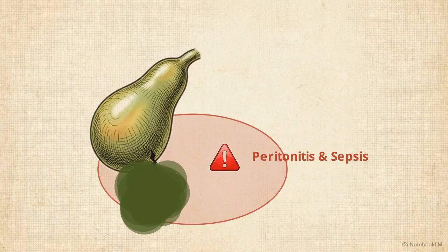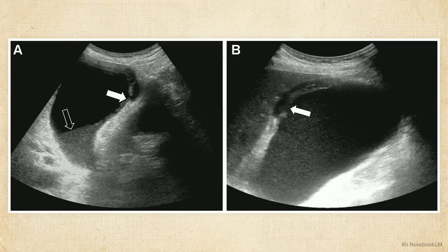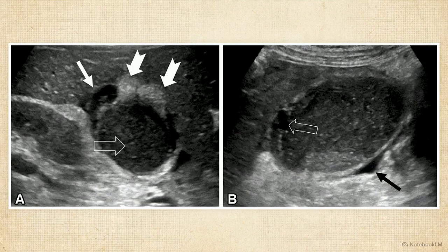This ultrasound clearly captures a blowout. You can see the distinct focal defect in the wall, with complex intraluminal fluid extruding directly into the surrounding space. Pay special attention to the bare area of the gallbladder, shown in this 2-panel series. The bare area lacks a peritoneal lining, meaning it is not an intraperitoneal space where free fluid should settle. Fluid localized strictly here strongly suggests a full perforation.